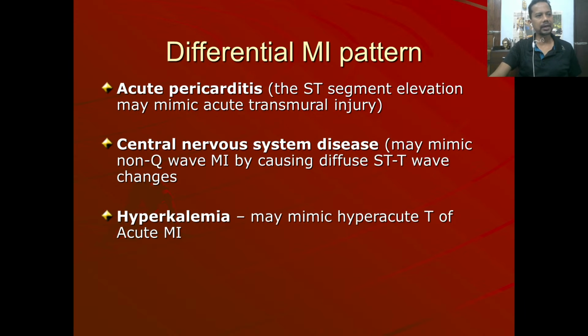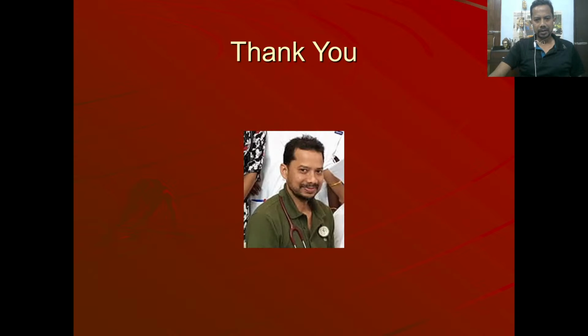Then hyperkalemia can cause hyperacute T waves, which can simulate the hyperacute phase of MI. So thank you guys, we have finished our MIs and conduction blocks, and after 1 or 2 days we'll discuss the arrhythmias, and then you'll be masters in your ECGs.